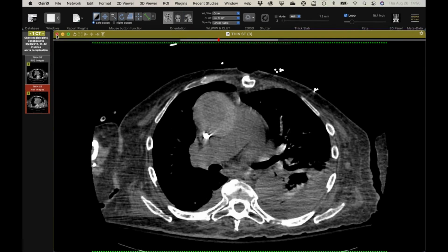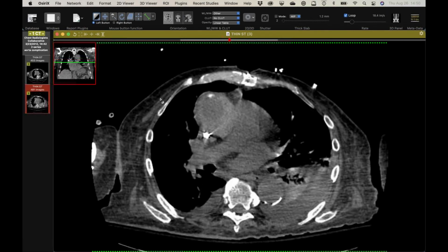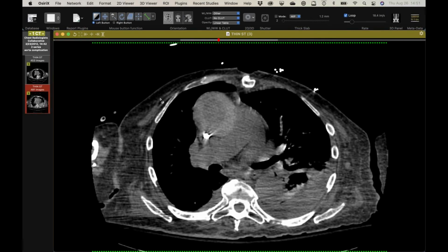Did you give contrast to show that that's actually blood and not just proteinaceous stuff? They did. I mean, I agree. A contrast study later showed it's blood. So okay. Yeah, because occasionally you just get those sterile perigraft fluid collections, but yeah, they wouldn't. Yeah. I mean, I agree. That's too dense. Right, it's really dense.